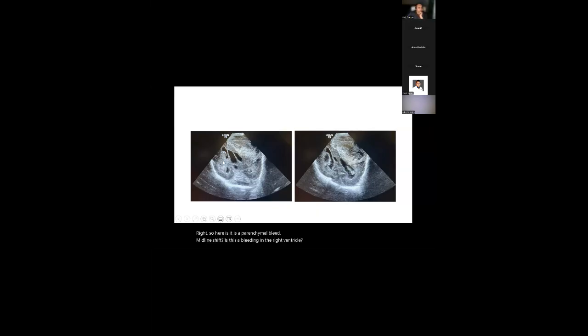You're right, there are two things visible. That's definitely hemorrhage, clot in that ventricle with a hypoechoic margin. For me, I think this is intraparenchymal as opposed to extradural, because you can start seeing breakdown, and with an extradural bleed you wouldn't see parenchymal breakdown.